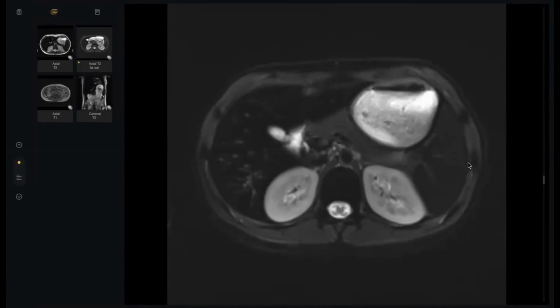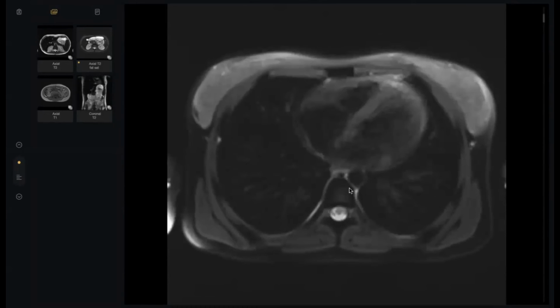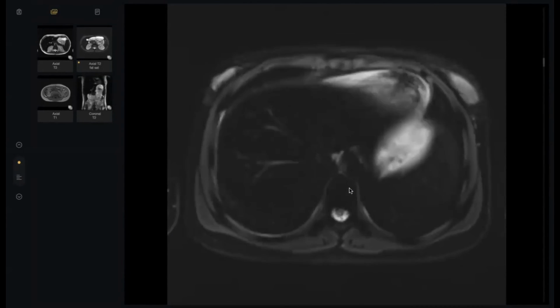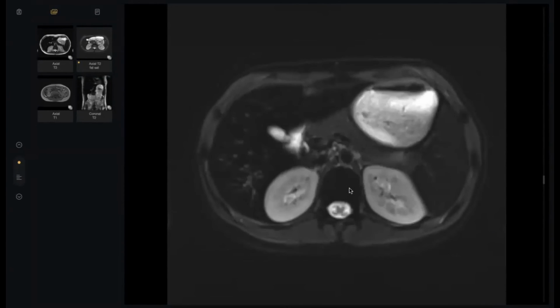Type 2 is the reticuloendothelial system iron overload. Very easy. Where is the reticuloendothelial system? Liver, spleen, bone marrow, and maybe lymph nodes. Very easy. This is very classic: dark liver, dark spleen, dark bone marrow. That is type 2. But in type 1, non-reticuloendothelial: from the beginning, heart, then liver, then pancreas, then gonads. Okay?